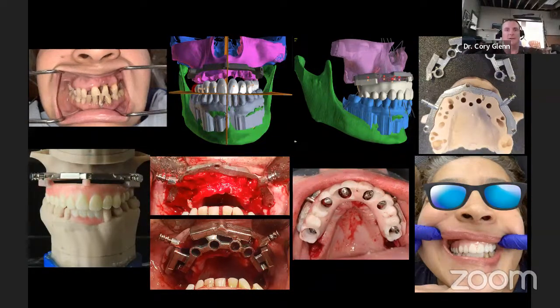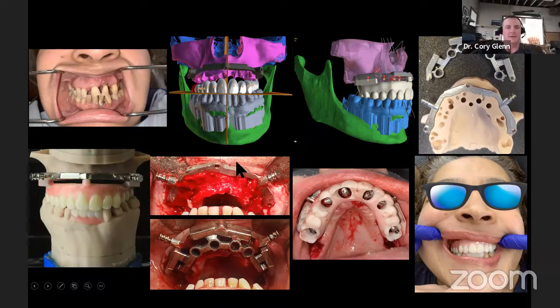I feel like you ought to go through the hazing of having to do manual segmentation for 3 years before you get to enjoy this feature, because God, it's a nightmare if you had to do this manually. All right, but we don't anymore. We punch a button, Blue Sky segments everything perfectly, and now you have jawbone models.